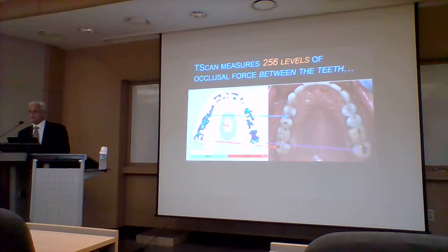사이즈는 같지만 힘이 다른 것, 힘의 강도가 다른 것들을 이 특별한 케이스에서는 알 수가 있고. And these marks here, which are smaller, are actually equal in force to this mark. 사이즈가 작은데, 사이즈 크기가 힘의 강도를 나타내지 않는다는 걸, as you can tell by the color coding.